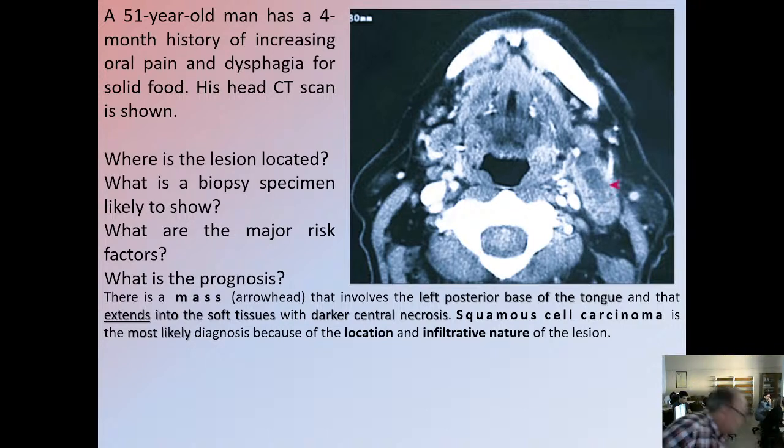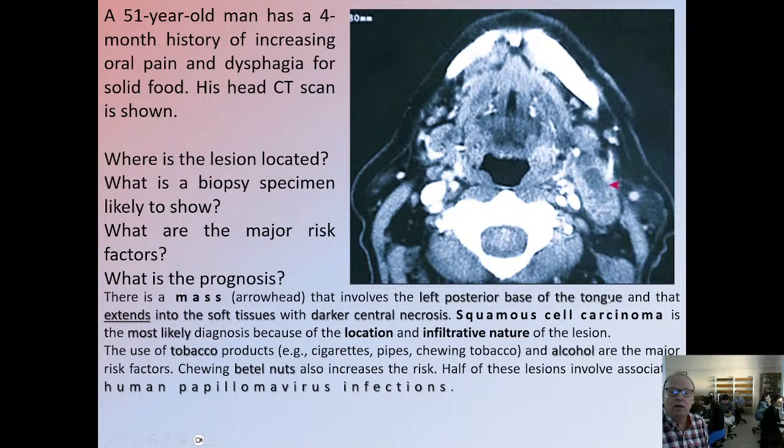And in this case, the histologic sign of malignancy is frank, true invasion. Remember what we said in our last lesson of some lesions that appear invasive but aren't invasive, such as pseudocarcinomatous hyperplasia, a rare lesion, fortunately rare, which, however, we must take into account so as not to overdiagnose invasion. So, this is what we expect to see from the biopsy.